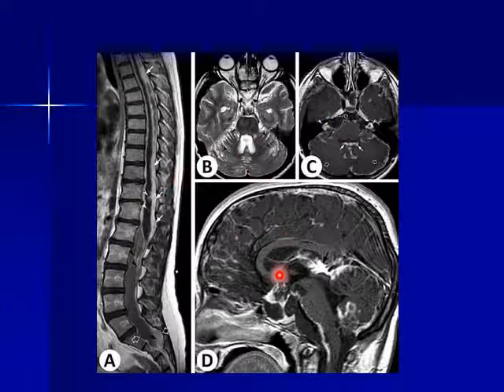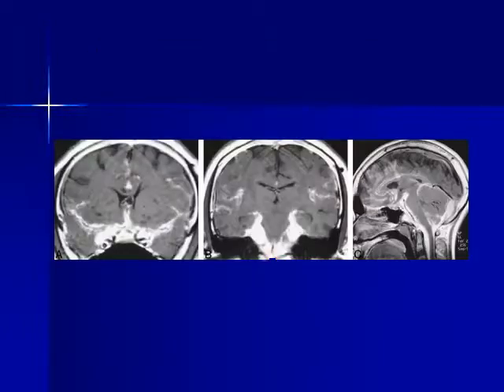Actually, if I see this, I would call it leptomeningeal metastasis. But put in mind, there is a tumor called diffuse glioneuronal tumor of childhood, which cannot be differentiated easily from extensive leptomeningeal metastatic disease.